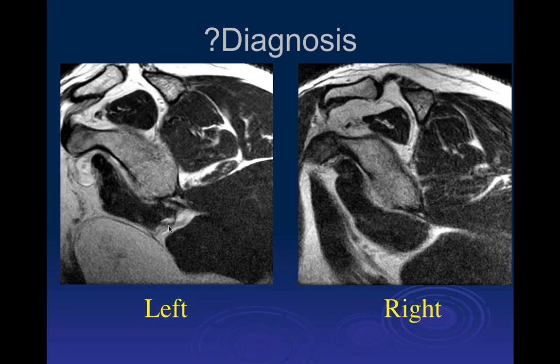So here's part of the area of the axillary nerve and vessels, and here's that area over here. We are seeing a little bit of irregularity and abnormality of a curvilinear structure there, and there's atrophy.